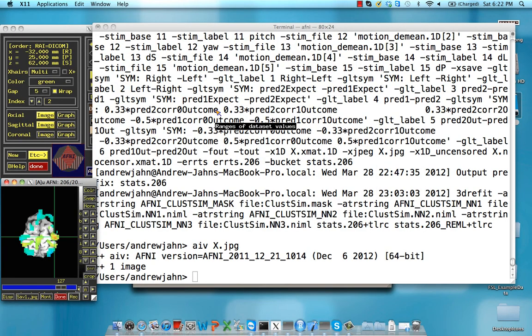Now recall that this is only one subject, so we're only using degrees of freedom based on time points for that one subject. If we're using degrees of freedom for a group level analysis, it would be the number of subjects minus 1. So if you have 15 subjects, then the degrees of freedom would be 15 minus 1, or 14 for a t-test.